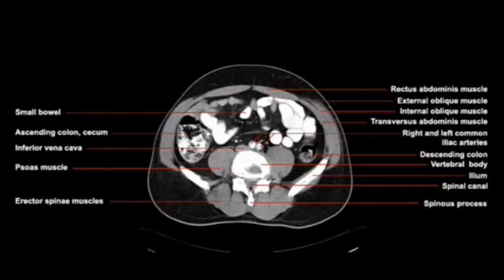One more slice that we'll look at, which again shows us some of the same information, but some new information. Notice how we go lower in the abdomen. The anterior portion of the abdomen becomes almost filled with small bowel. Something else that we can see that's very important here is we now actually see 3 round structures on the anterior side of the spine, and that's because the descending abdominal aorta has now bifurcated into the right and the left common iliac arteries. The inferior vena cava also is the result of a convergence of 2 vessels, but we cannot yet see that separation. Psoas muscles are still visible on both sides of the patient's vertebral body.